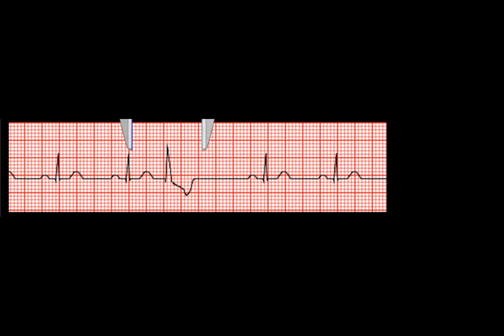And we move this down. I'm going to mark here just that there was supposed to be a P wave there. I'm sorry, a QRS complex there. And we'll move this back down. And that falls right where it's supposed to. And so does that one.